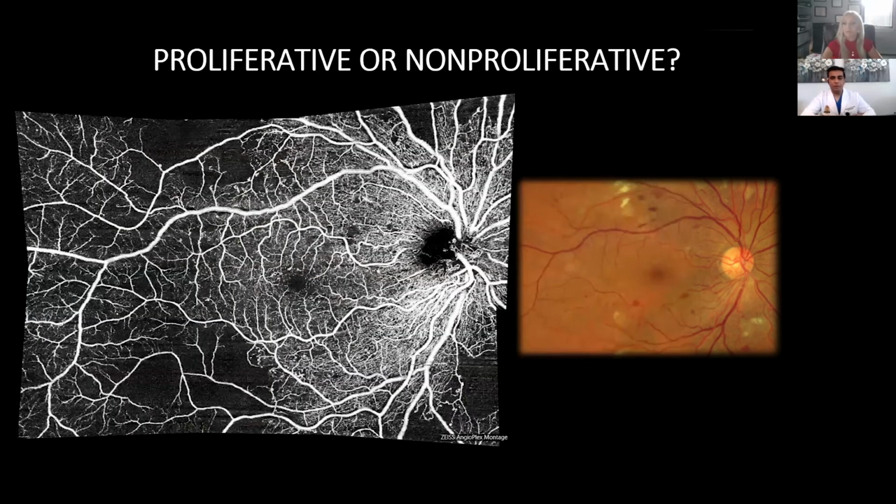And as we are seeing more of these patients, we are realizing the old myth that diabetic retinopathy for type 2 is only going to be in the posterior pole is being challenged, because as we are imaging wider and wider, you realize a lot of these patients actually have mid-peripheral and peripheral pathology, which the conventional thinking is only present in type 1. A lot of times when I see predominant peripheral retinopathy lesions, I'm more likely to think, oh, there's some sort of carotid issue. But I'd say probably only 1 out of 10 actually comes back with significant stenosis that maybe explains it.